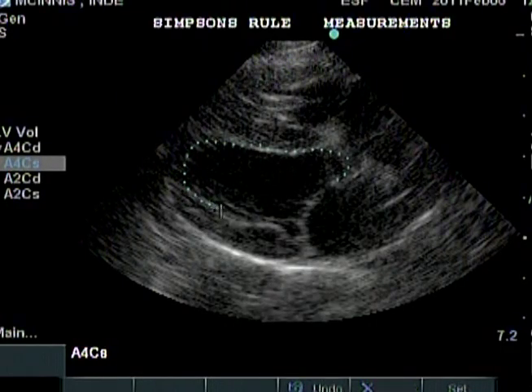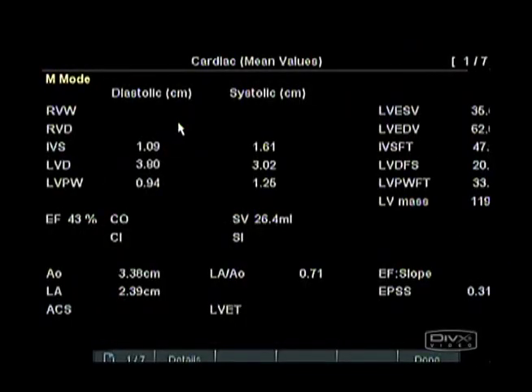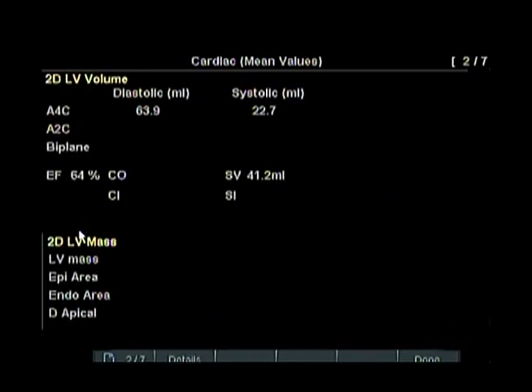If damaged heart muscle results in poor contractility at the M-mode cursor line, other cardiac muscle may compensate by overcontracting, and the actual ejection fraction will not change. If an ejection fraction by the Teichholz method is low, the measurement can be repeated by Simpson's rule to confirm the result. This is important when Teichholz measurements suggest dilated cardiomyopathy.